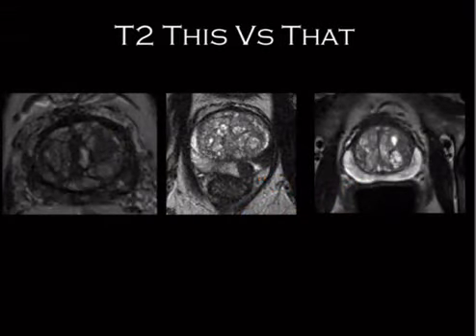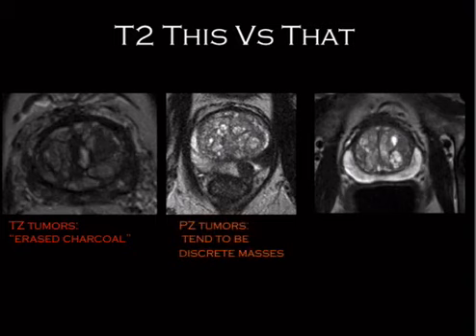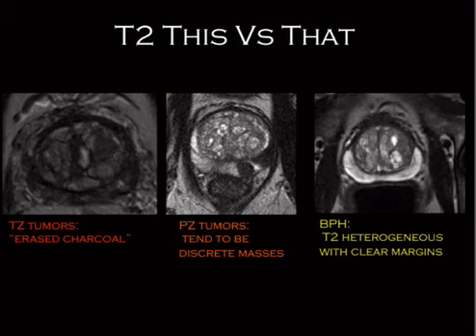So let's look at three different T2 findings. We had our transitional zone tumor in the central gland, which has got this erased charcoal. We've got a peripheral zone lesion, which is dark and more discrete. And then we've got these BPH nodules, which are heterogeneous. All these different guys here. You see this pretty much on every single study. That's what they look like.